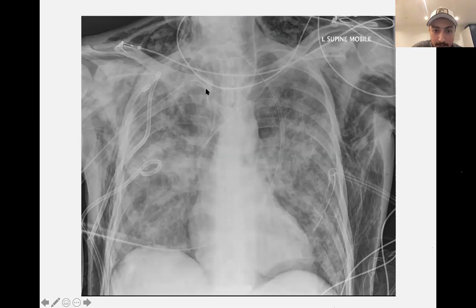That's the left clavicle, that's the right clavicle. And you can slightly see the vertebra. And so you could say adequate exposure. And also here you could see 1, 2, 3, 4, 5, 6, 7, 8, 9. So there's enough inspiration. So actually, that's a good quality X-ray. So if you look at the airways, it's a bit hard to look at the trachea in here, but it's slightly in the middle, so it's not deviated.